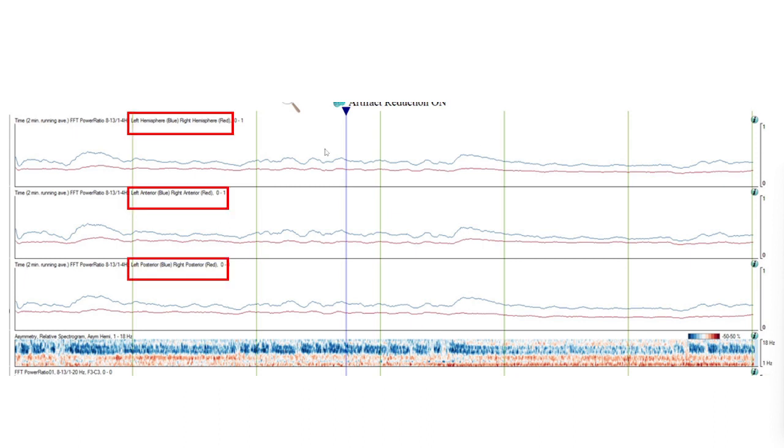Just like relative alpha variability, separate location-based trends can be made for each hemisphere, quadrant, or 6 subdivisions including the right and left frontal, centrotemporal, and parietooccipital regions. Red line graphs typically represent activity on the right side and blue line graphs represent activity on the left side.